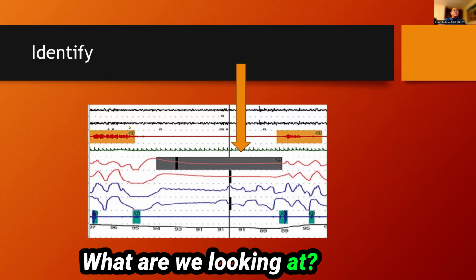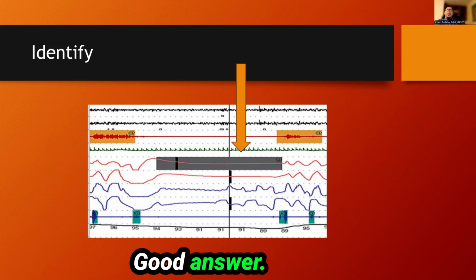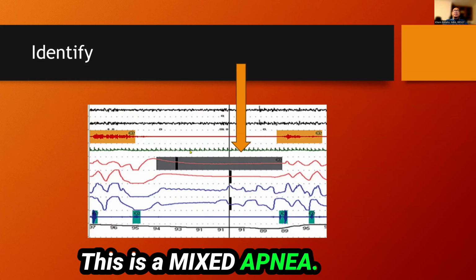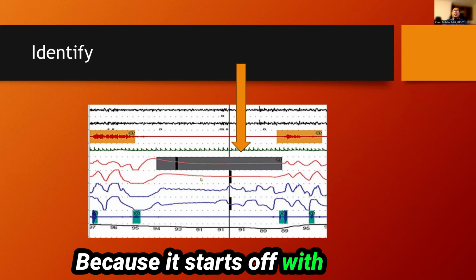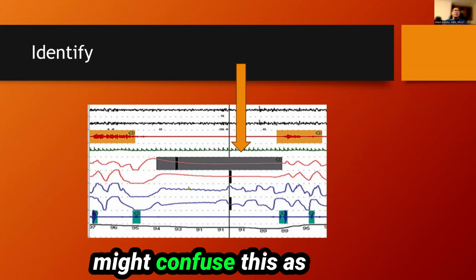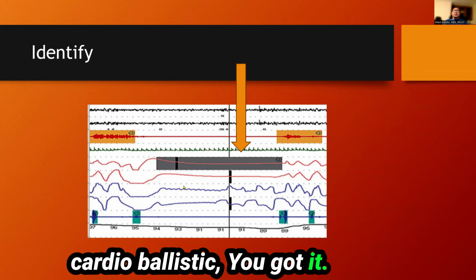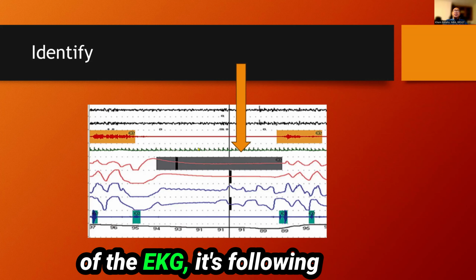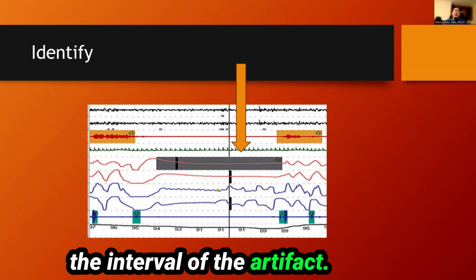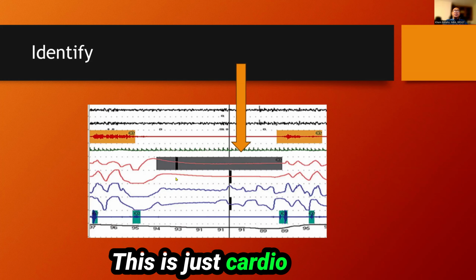What are we looking at? Okay, I hear mixed. Anybody else? Good answer. This is a mixed apnea. Why? Because it starts off with a central apnea. You might confuse this as effort, but it's not. It's just cardioballistic. If you look at the interval of the EKG, it's following the interval of the artifact. So you know for a fact that this is flat. This is just cardioballistic artifact.